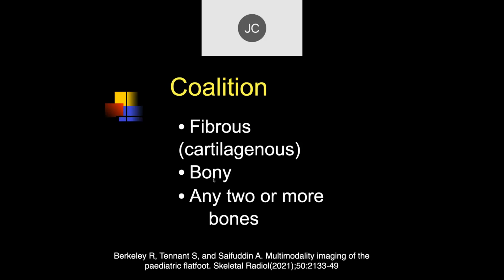That changes the forces throughout the entire rest of the ankle, and often leads to other deformities because of the change in the force pattern through the bones. Typically, it's associated with marrow edema in the areas of high stress, which is associated with symptoms.